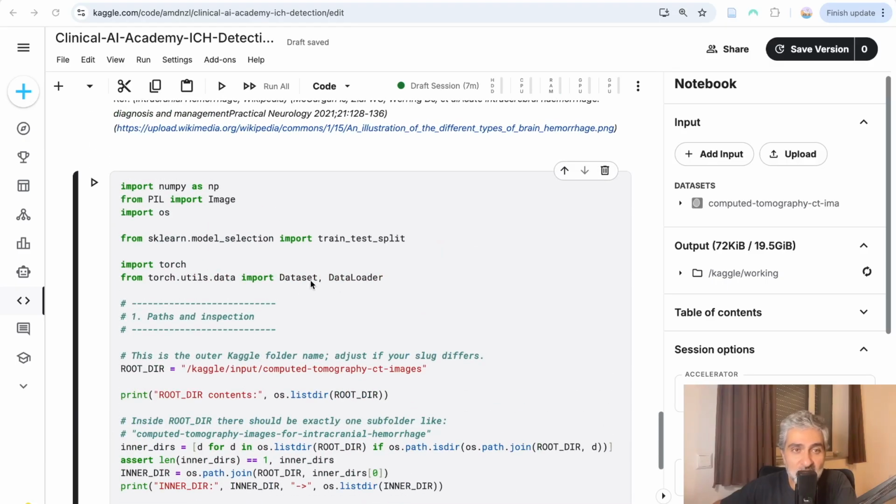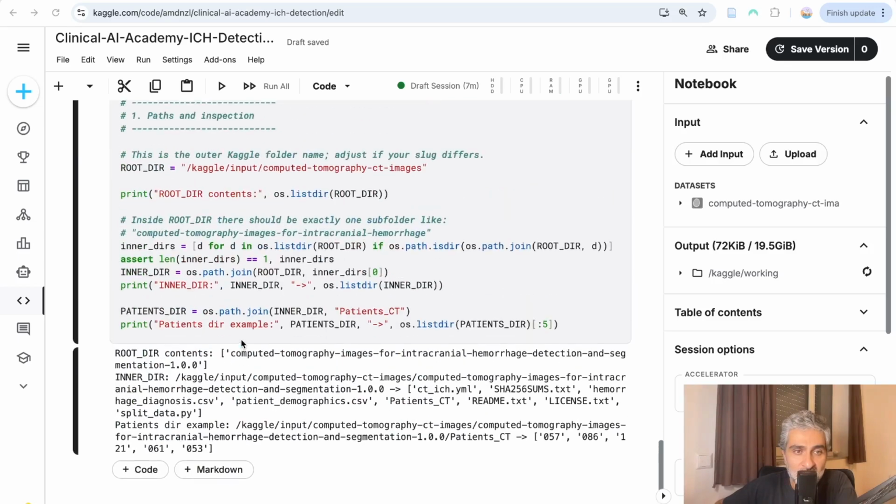They prepare the data structures, referred to as tensors, that the models can deal with, which is basically just columns of data, pairs of the images, the slices, and their labels. So the next thing is we define this.